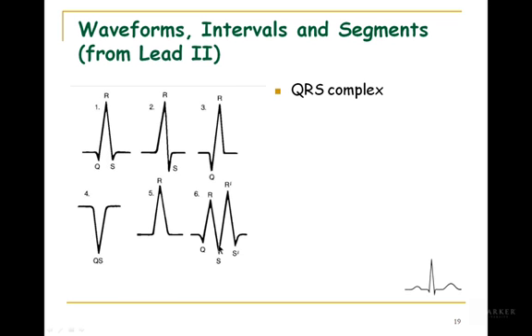And some people have, well, there could be multiple variations. This is a QRS, R prime, S prime. If it goes back above baseline, that's an R prime. If it goes back below baseline, they call it an S prime. I've actually seen R double primes and S double primes, where it went up again. I refer to this as the bunny ears. All of these may be considered normal as long as the duration of that complex is fine. So even having these bunny ears may be perfectly fine if the duration is fine.